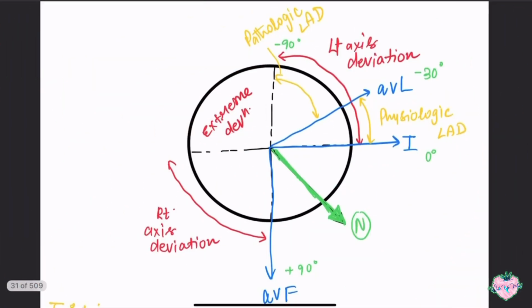Hello everyone, so today we are going to learn about the axis deviation in ECG. I'm going to share with you a very simple and easy trick to learn about the axis deviation so that you won't be able to forget it, okay? So basically you will remember it for a very long time.